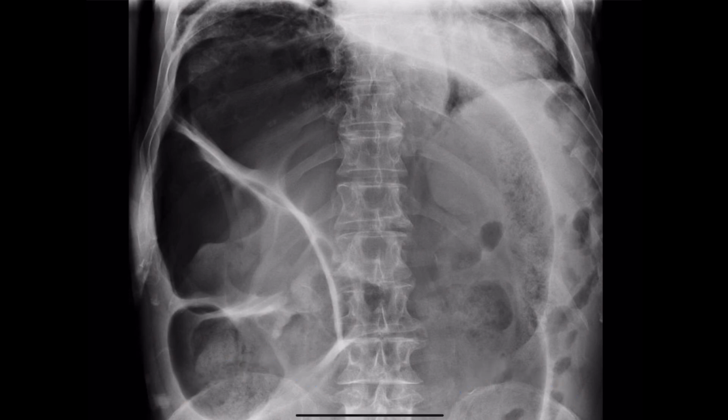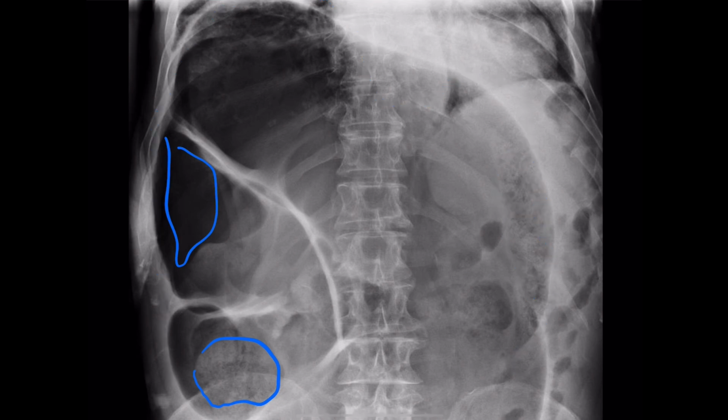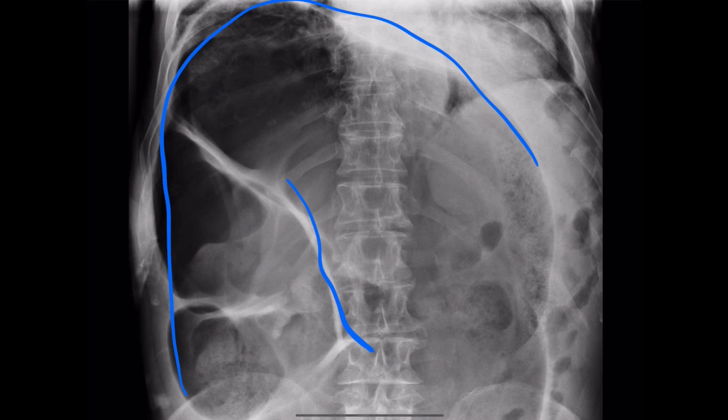And I think it's pretty obvious that there is a big dilatation, a big gas-filled loop of colon. The colon is either full of air or poo. Can you point out the air and the poo to me? Well, poo generally has this sort of mottled look. It's sort of patchy. Whereas air is just black. And if you trace it, you can see that the large bowel is just grossly distended. There is, and in fact, it has something extra though.